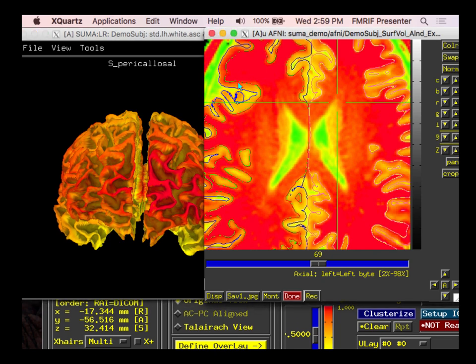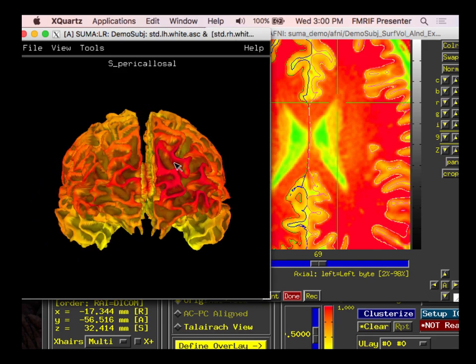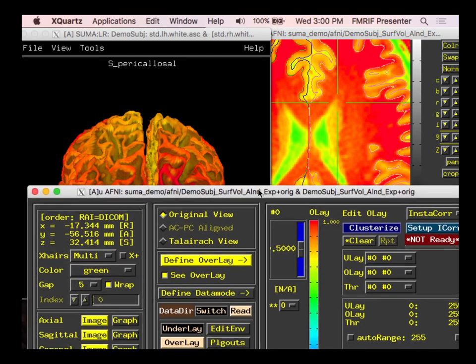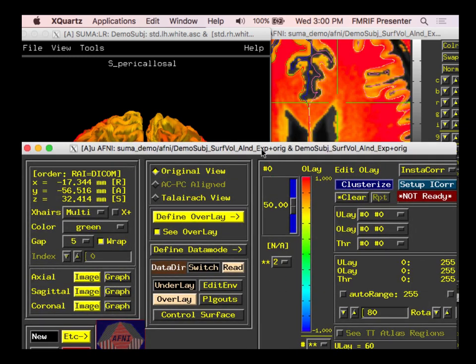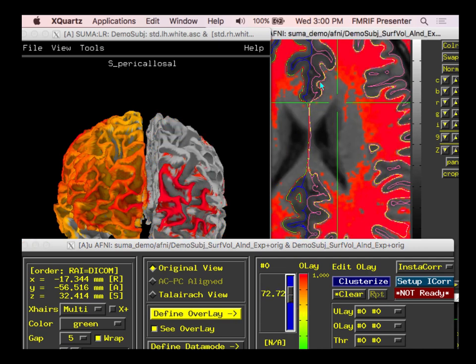And now wherever this intersection is happening, that color is being brought here, and that color represents a number that's important somehow in the data set. And so I can visualize it here. And it happens interactively, so as I change stuff about it, let's say I can change the thresholds, as I threshold my information here, the same threshold applies here.